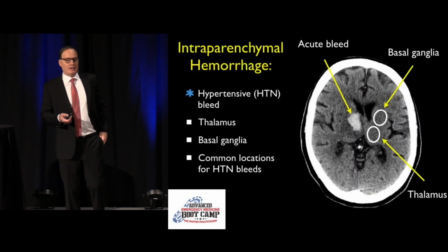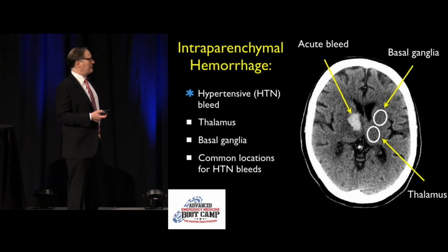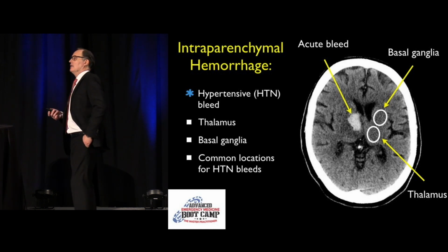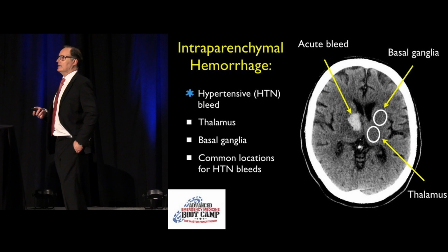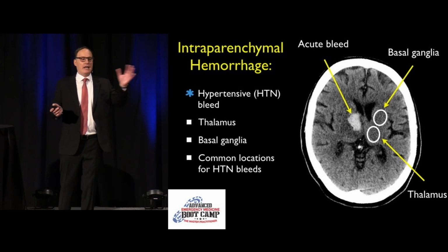So let's start taking a look at some cases of clear pathology. This is a patient who comes into the emergency department with a blood pressure of 220 over 140, severe headache, and the patient is very ataxic and has some nice nystagmus.